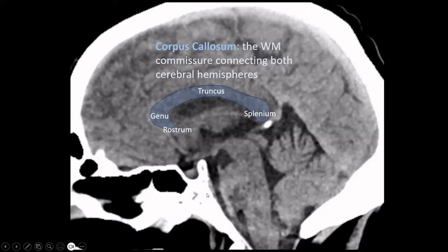We're almost through with our discussion of brain anatomy on CT. Maybe I'd just like to point your attention to the pituitary gland, located over here, best seen on a mid-sagittal CT image and located in this depression in the sphenoid bone called the sella turcica.